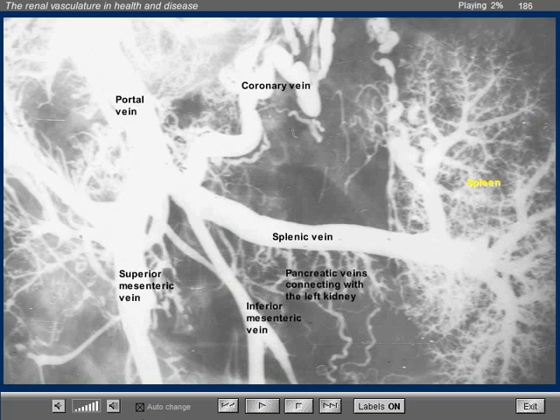We did this cadaver study injecting barium in situ into the portal system. Note the splenic vein that receives veins of the tail of the pancreas, which are perpendicular to the undersurface of the splenic vein. Also note the entrance of the inferior mesenteric vein almost at the angle of the splenic vein with the superior mesenteric vein. The superior mesenteric vein is the large channel seen to the right of the inferior mesenteric vein.